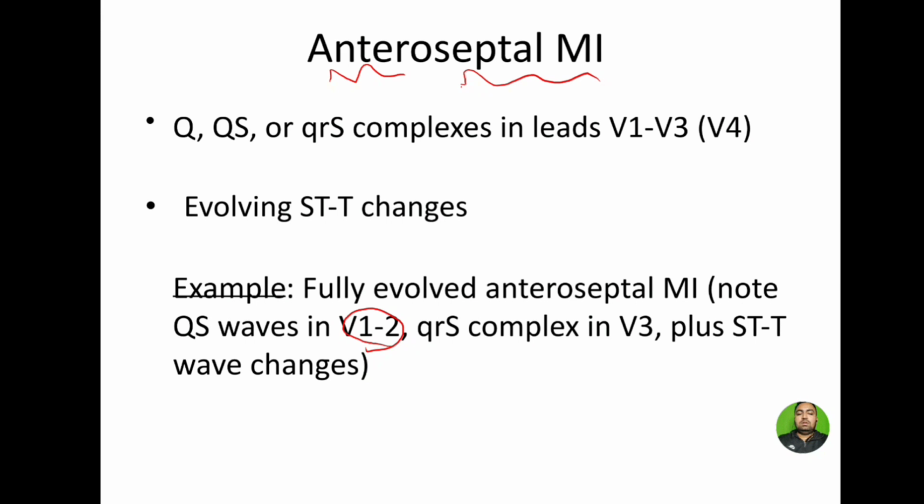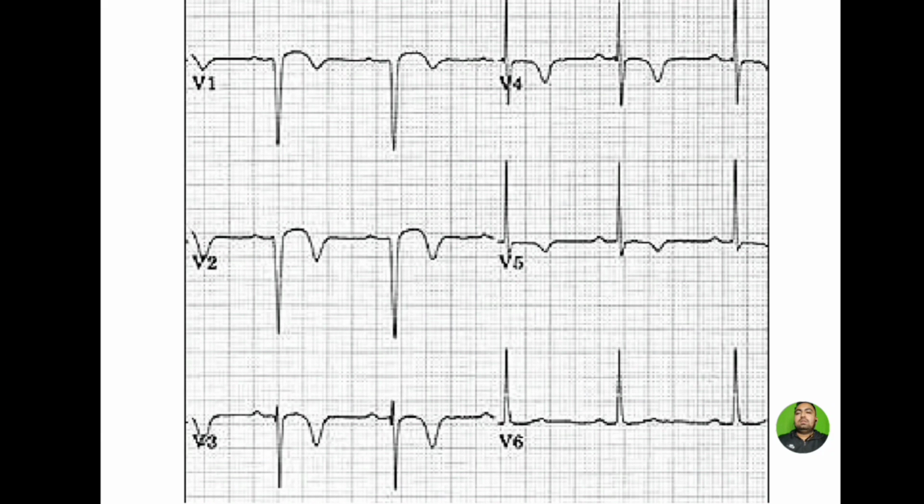Now let us see that there is deep Q wave, deep QS, deep QS.